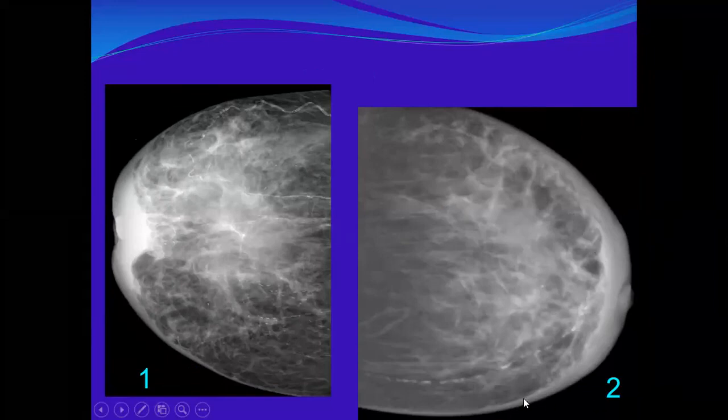Unless the cause is chronic and long-standing and there is dependent edema. And here I could find some global asymmetry. I need to clarify this global asymmetry to make sure there is no underlying focal lesion. So I will report it as suspicious.